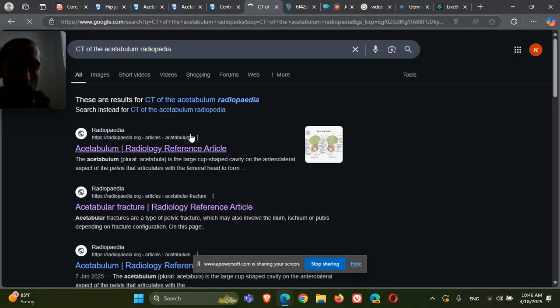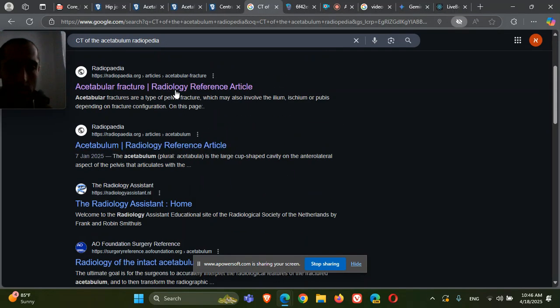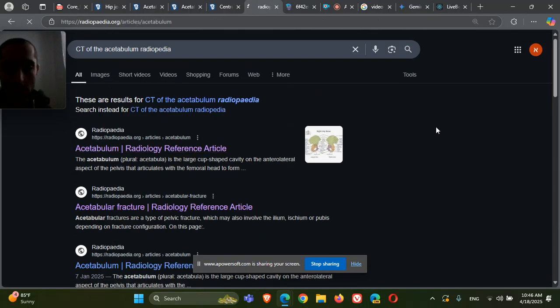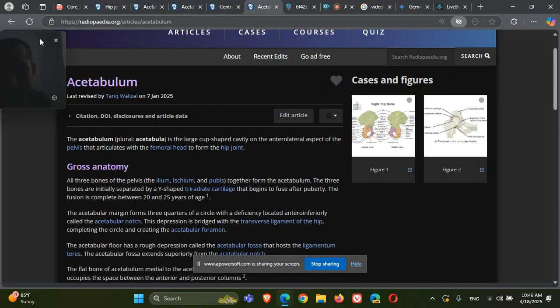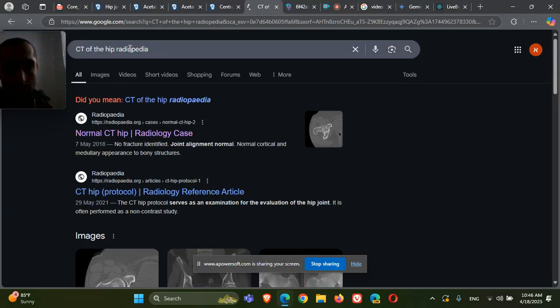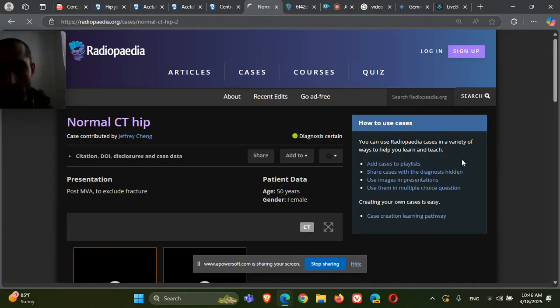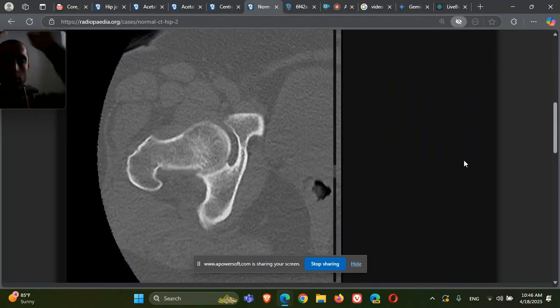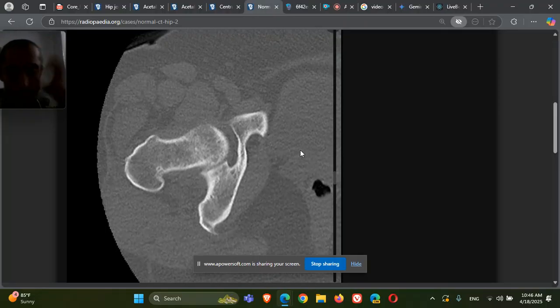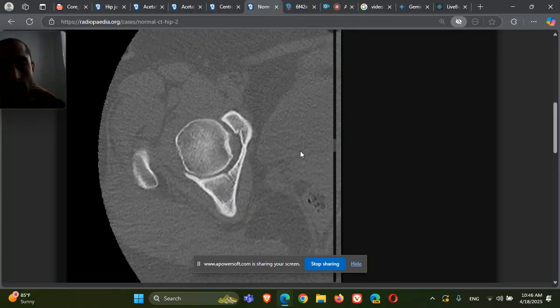I want to show you some, maybe I'll find over here. Let's look on the hip using CT and let's see how it goes.